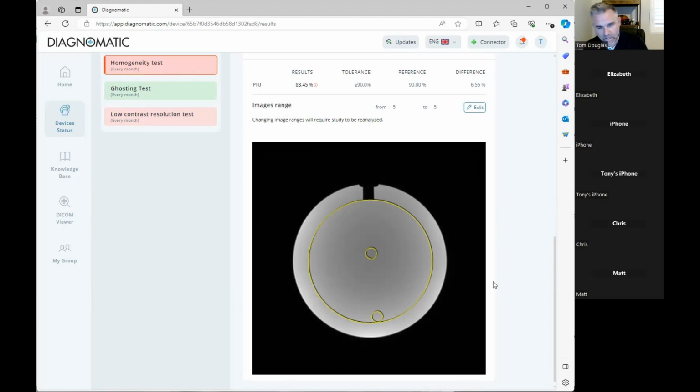This is another one where, if you have problems with it, sometimes it can be from a lack of centering, like the patient or the phantom is too close to one side of the coil. You might get some ghosting from motion, eddy currents, or it could be a coil failure, or components having some issues. So it could point to larger issues.